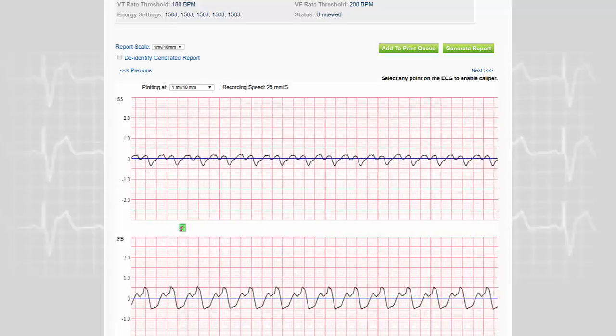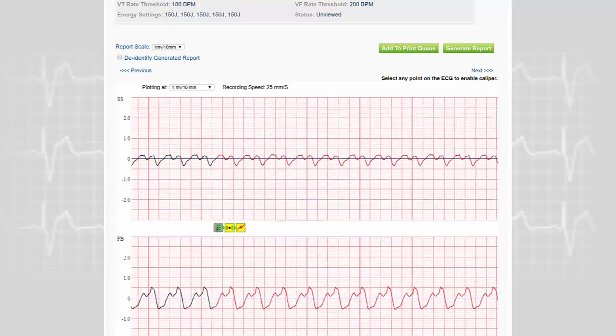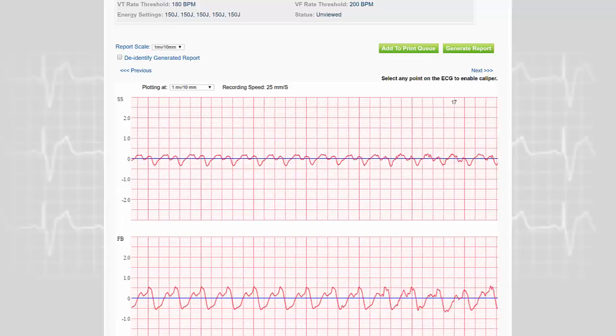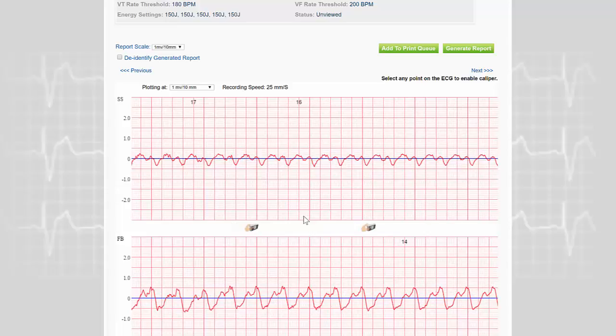So the alarm will start here, and then after a certain delay, the patient will press the button and no inappropriate therapy will be delivered. So this is the case of inappropriate diagnosis of ventricular tachycardia during an episode of supraventricular tachycardia.